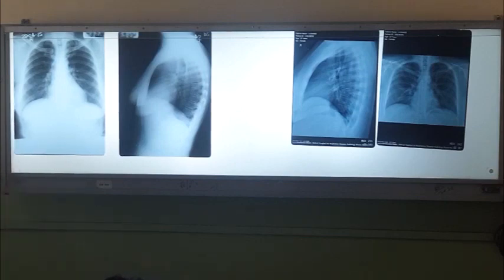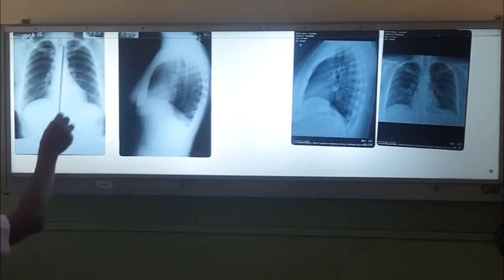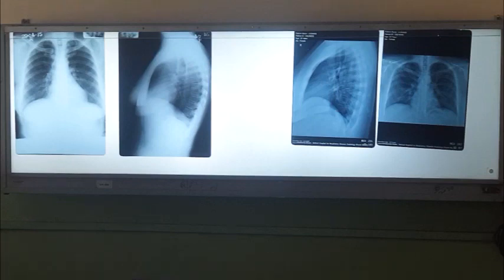Other thing is the X-ray exposure, right? Just remember, your intervertebral discs should be barely visible through the cardiac shadow if the exposure is good. Intervertebral disc should be barely visible through the cardiac shadow. If you can see the whole spine, then that is overexposed, so everything will be dark, and then you can easily miss a pneumothorax. And if you can't see the intervertebral disc through the cardiac shadow, everything will be whitish, and all these whitish areas may be due to soft tissue shadows and may not be inflammatory shadows.